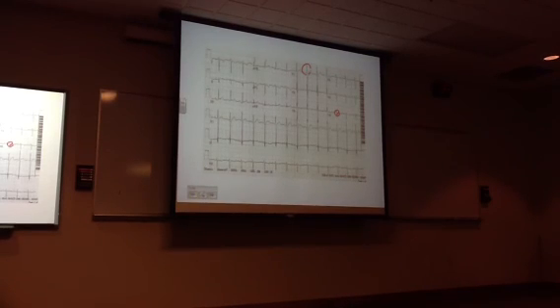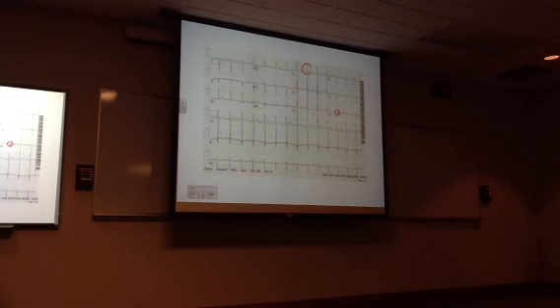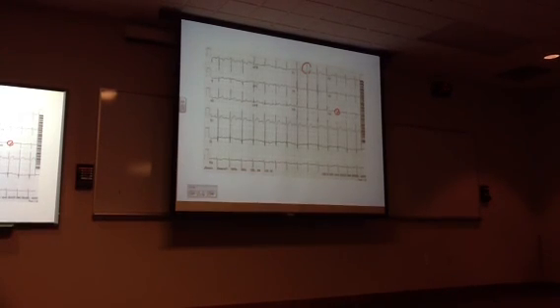What if I told you I put a stethoscope on the left chest and I didn't hear heart sounds? Put it on his right chest and I hear a nice heartbeat. Dextrocardia. This guy's got dextrocardia. All right? That's why AVR is messed up. Now my ventricular depolarization is going toward my right shoulder, and that's why it's positive, as opposed to being in the left chest going away.